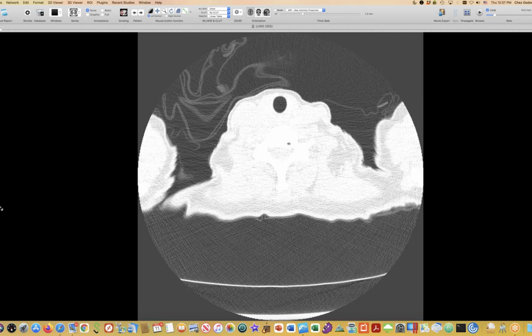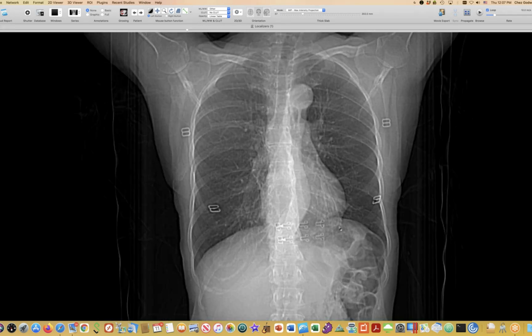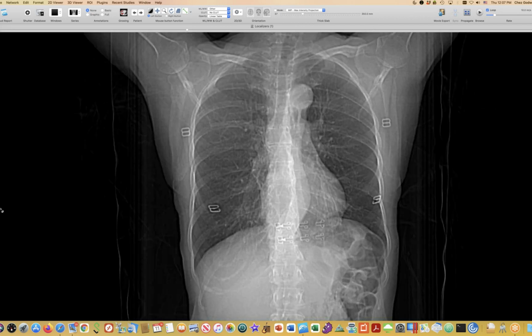All right, this woman, I was asked to do diaphragm fluoro on her because she's very short of breath. And when I did the fluoroscopy on her, I observed that she didn't move her diaphragm very much on either side. And I attributed that to really her hyperinflation. When she takes in a deep breath, her diaphragm doesn't have much farther to go. So she doesn't exhale very much air, evidently. So her diaphragm motion is really secondary to her hyperinflation here.